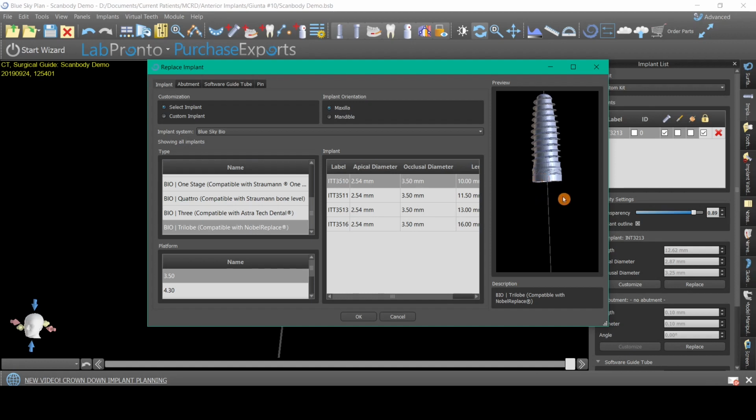And that's the key here, because when I attach a scan body to this implant system, I want it to equal the same platform location as my surgical guide is defining, right? My surgical guide is defining where my implant's going to go and the level of my implant platform, and that can't change in this process, and essentially it doesn't. So that's a good thing.